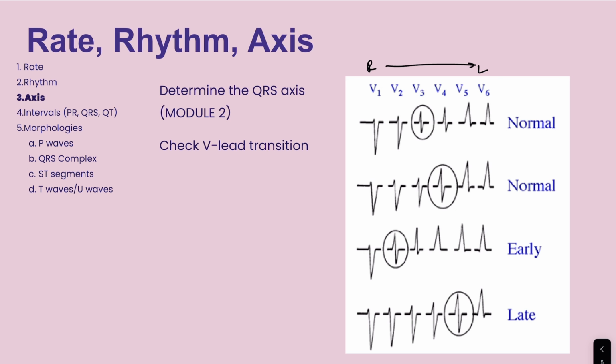Okay, so what we would expect to see is on the right side of the heart, we want a negative QRS complex. We want a negative deflection because we expect the signal to be away from the bulk of the flow that we would expect it to be going. It's going in the opposite direction, so we should have a negative deflection. And then when we get to the left side, it should be a positive deflection because it is going the direction that we expect it to go.